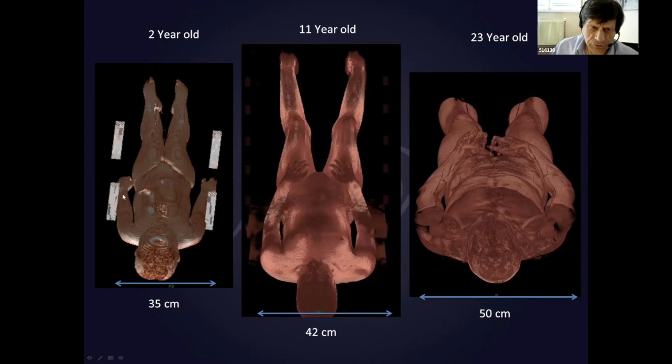It's important not to cut the upper limb because you have details in the upper limb that are important for pattern recognition. So the technician has to be careful to place the upper limbs on the trunk or just in front of the trunk, but not to cut the upper limbs.